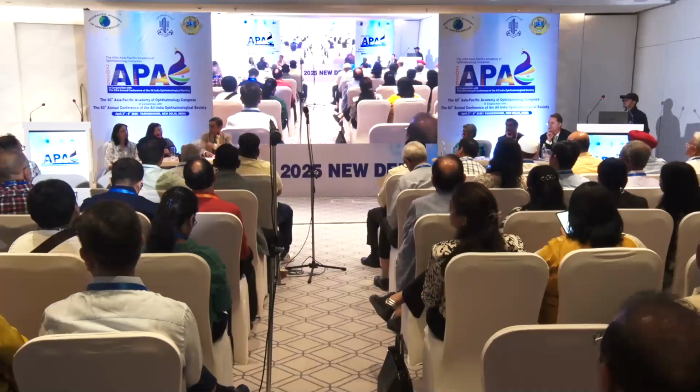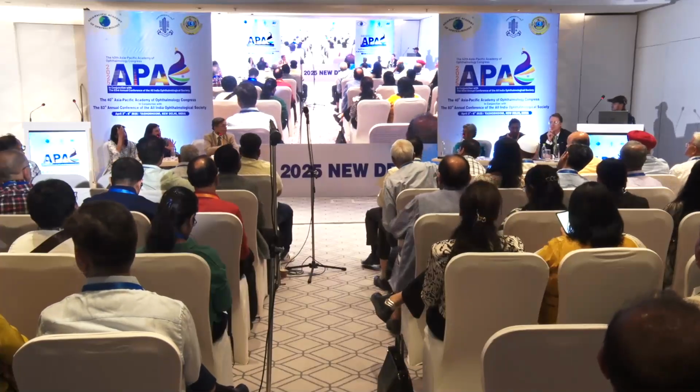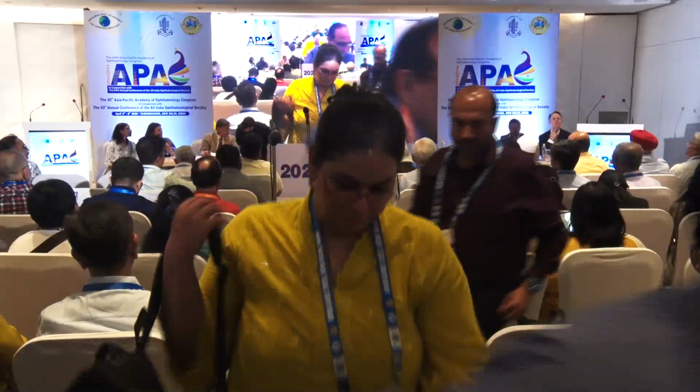I would like to have one question for Dr. Naresh. Sometimes if there is a large PED in the center, it's very difficult to visualize the BVN under it. Is there a way to do anything to see better?